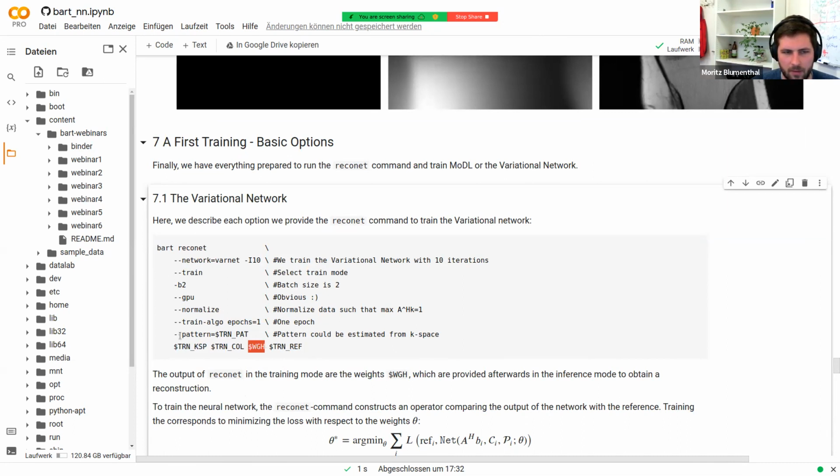There is a reason, because it does not follow the usual BART structure everywhere. If we train, the train reference is an input and the weights is an output, and I think the MATLAB wrapper would only expect the last argument as an output. There's also the fact that we store multiple CFL files at once in the weights, and that's probably also not covered by the MATLAB wrapper.